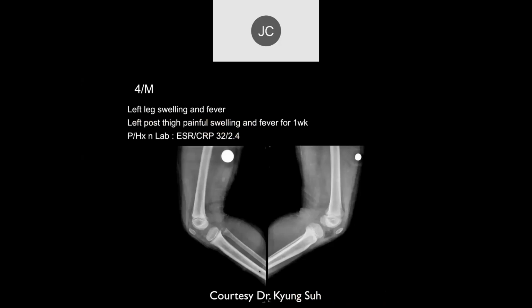And it doesn't have any cover to it. It just looks like it's spreading out with no fence around it.